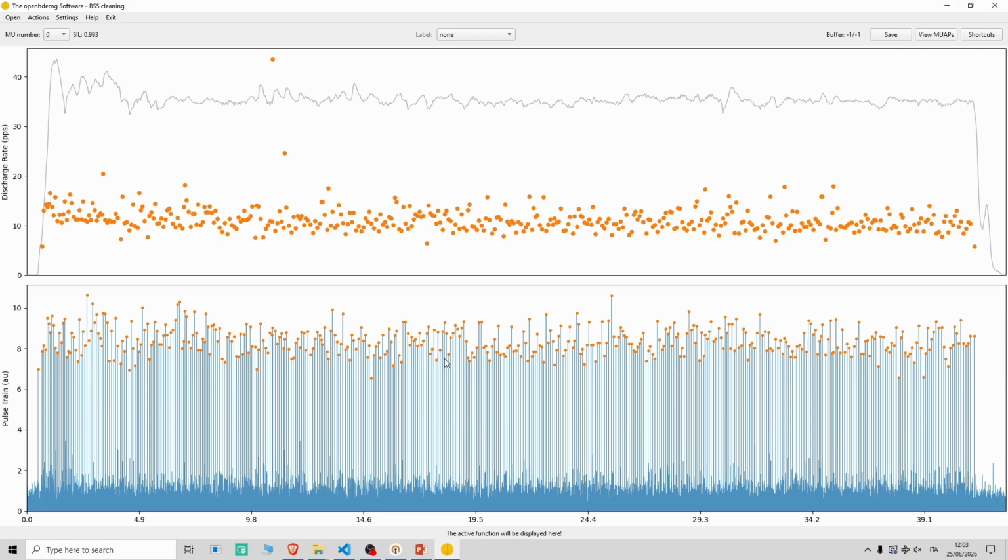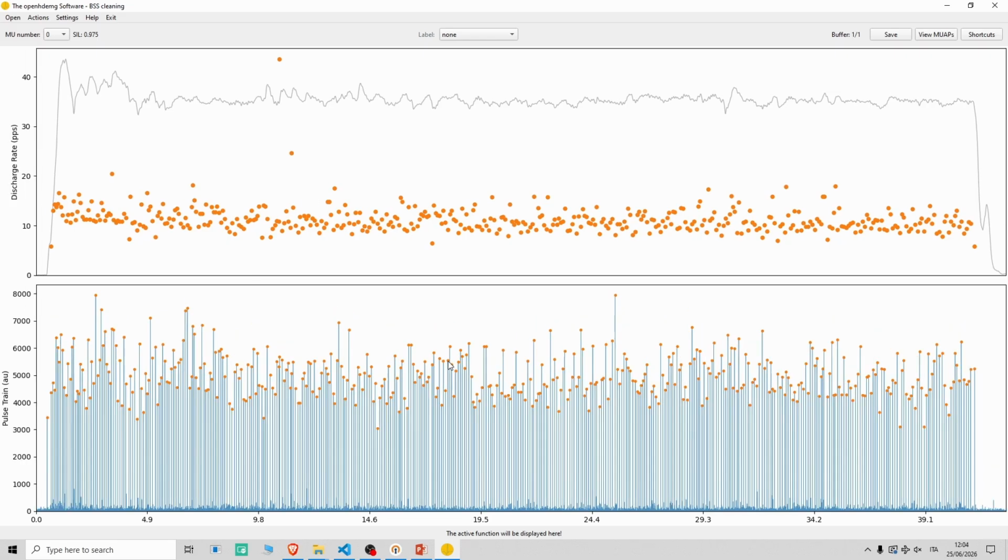When we open the motor unit for the first time, we show the user the raw result of the decomposition. Then during the cleaning, we are using in reality a nonlinear transformation of the source to optimize the separation. And we can simply call it with a shortcut button on the keyboard.